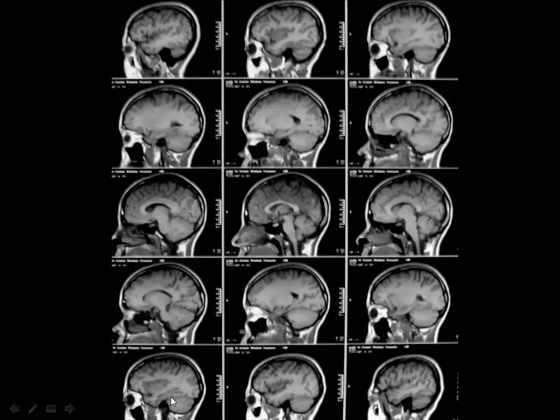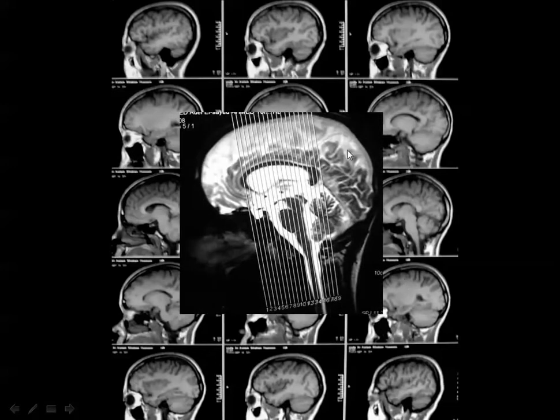Then these are the sagittal images, and you all know that we start in the sagittal images from the left, and you proceed to the midline, then we reach the right side of the patient. If you are asked about this lobe, this is the left frontal lobe, and this is the left temporal lobe, and this is the left cerebellar hemisphere, and this is the left parietal lobe, and so on. But in the midline image, you should not see any brain tissue. You should see only CSF, like this sagittal T2 weighted image, and you can see CSF in the midline. This can be seen if you are cutting exactly in the interhemispheric fissure.